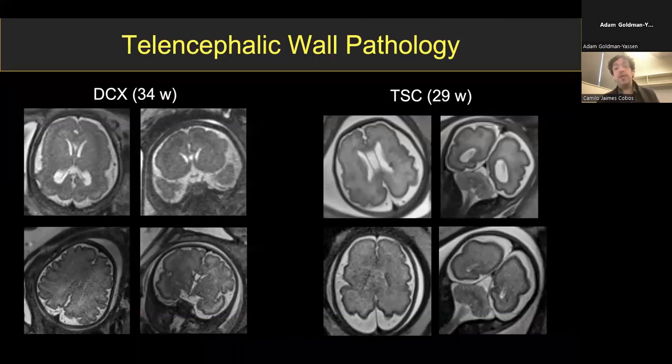There's also pathology with lamination. I mean, you can see plenty of malformations. I am bringing two that are quintessential in and of themselves. The first one is a band heterotopia, and you can see two things here. You can see a band of neurons that didn't quite make it all the way to the cortex. I'm not going to discuss too much about the pathophysiology, but as you know, this is an X-linked disease. So this is a band heterotopia because one of the X chromosomes carries the genes, and then when you inactivate one of them, some neurons don't quite make it out.